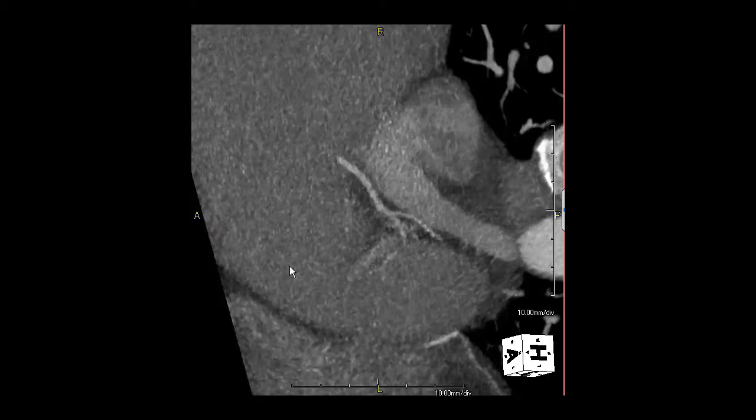However, there appears to be complex plaque in between the proximal and mid-LAD that is not obstructive. However, there is evidence of what appears to be obstructive disease and also complex or mixed plaque involving the first diagonal. The left circumflex and the right coronary arteries are grossly normal.